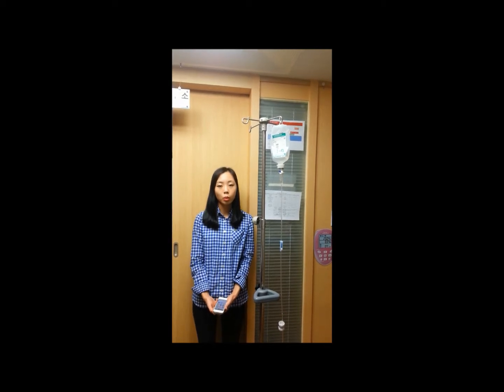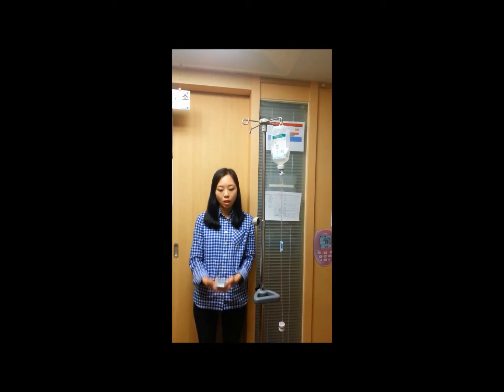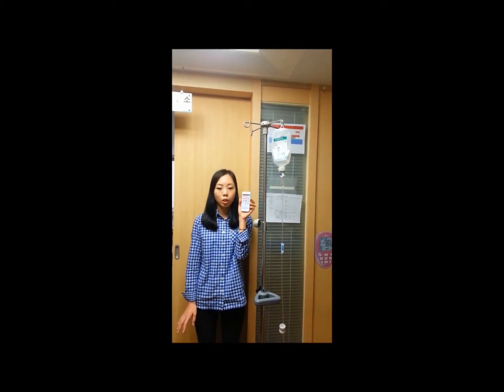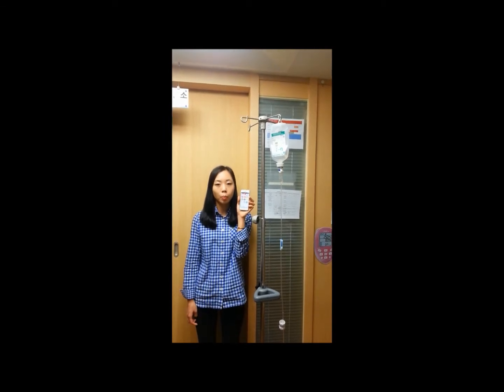One of the first things that a nurse or member of staff has to do is a tricky mathematical calculation. It is not difficult, but it is easy to make mistakes when in a hurry. But using a software calculation tool, the IV Therapy Helper can easily and simply calculate the drip rate and drip interval depending on the prescription that has been written up by the doctor.